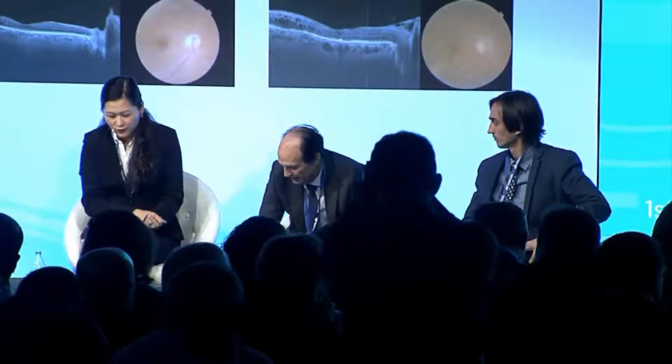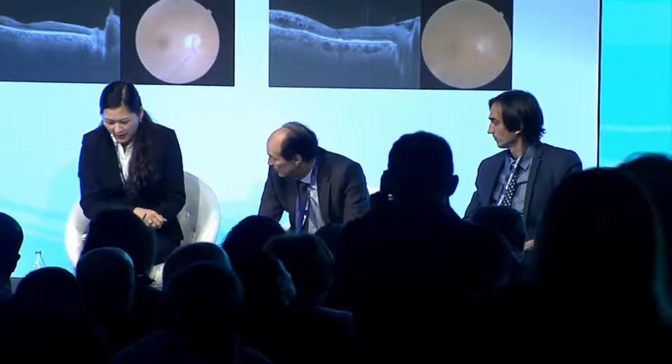Okay, please. We have a question asking about the role of Bruch's membrane in the elongation of the eye, as Prof. Ohno-Matsui described in the last review. And what do we think about it? Well, I think that the Bruch's membrane does have a significant role. As I said earlier, we don't really know for sure the individual contribution of the different parts of the eye in the development of posterior staphyloma and myopic macular degeneration at this point in time.